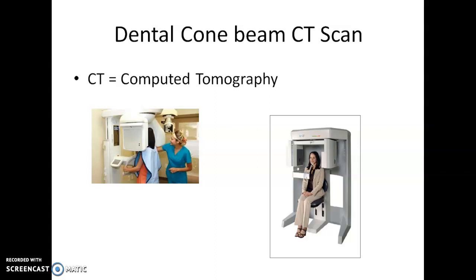On the office that you work at when you graduate, you may run across some dental cone beam CT scans. And I wanted to go over those very quickly just so that you're familiar with them and you know how to read those as well. This is a very advanced technology. Typically you won't see this unless you're working in a perio or an oral surgeon's office. Because of the technology involved, it's just not something you're going to run across very commonly in a general practice and that sort of thing. So I want to go over that really quickly.